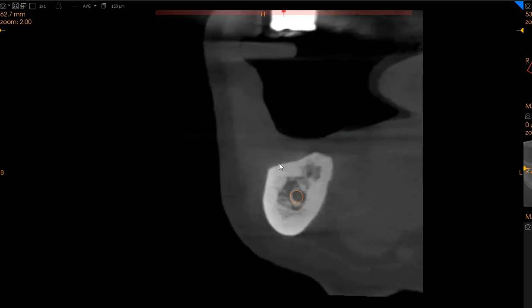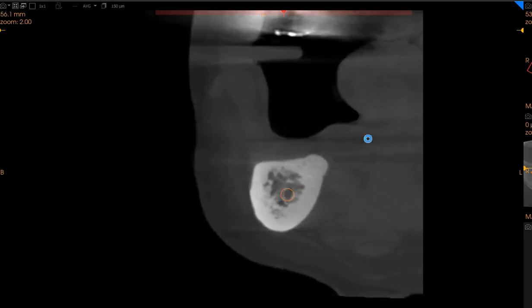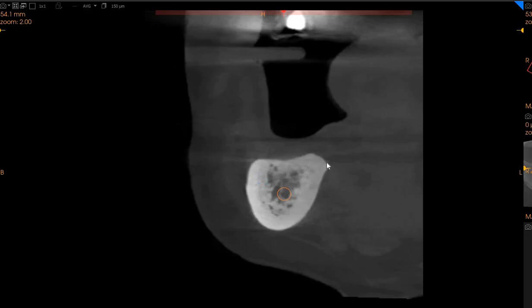And if you go to the region of the 5, again very limited bone in terms of height, 10 millimeters of width with just 5 millimeters of height. Moving to the region of the 6 here, again the ridge is thick enough but does not have sufficient height. We only have 5 millimeters of height to the inferior alveolar nerve and D1 quality bone.